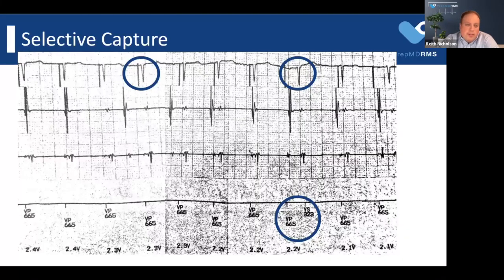So if you don't have a surface, you're already behind the eight ball, but you need to be really careful that you understand what each of these deflections are, because it's more than you're used to on a normal pacemaker. Yeah. And I think that will lead us into a conversation later about troubleshooting if we see these signals.